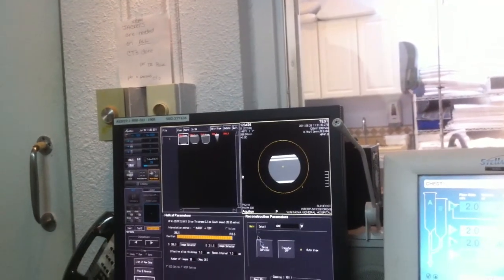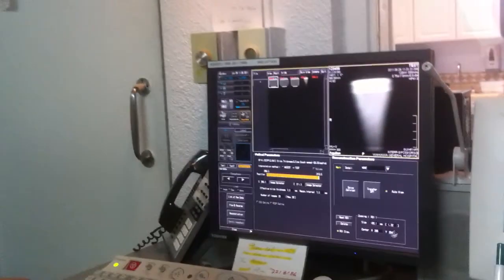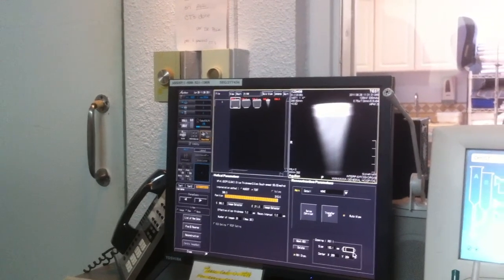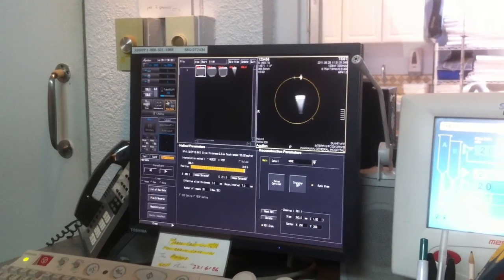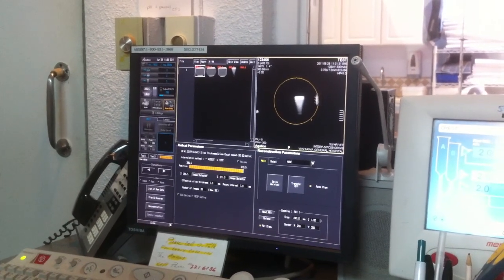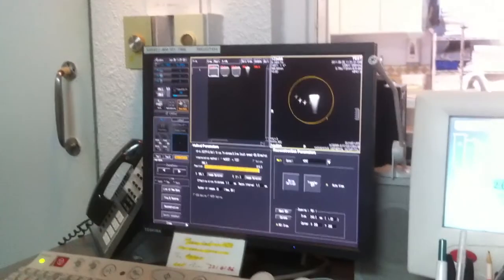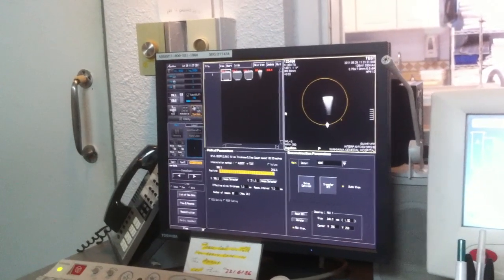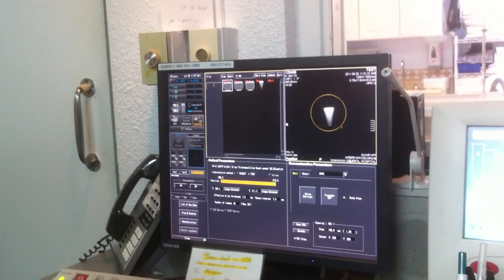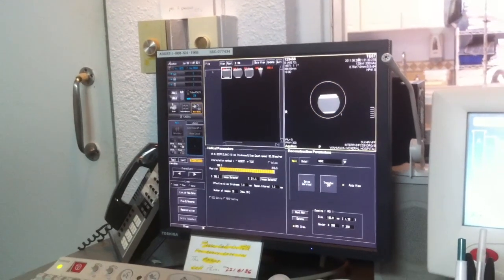She's the only one that noticed what I just did here. When we first loaded this was like this, right? It was really big. Yeah. What I did was I put a 1 here. When you put a 1 there and shrink it down, it tells you where the exact center is and how big you can go. Right now it's at 240. That's the biggest you're going to get right there, and that's the only place you're going to be able to go. So that lets you know what you can do. Okay?